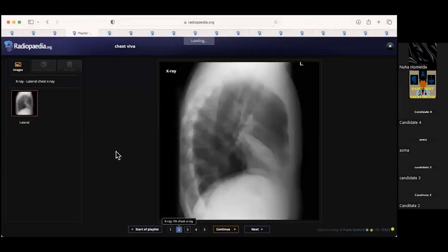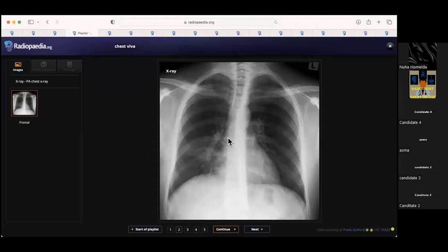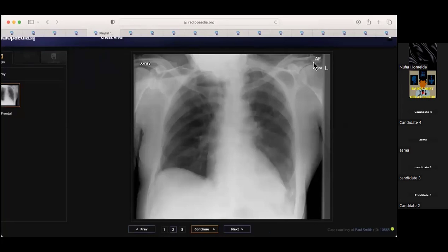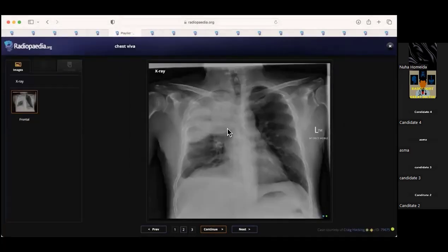This was a case of a middle lobe. Whenever you see the right heart border ill-defined, you have three diagnoses: middle lobe collapse, middle lobe consolidation, or pectus. You need to show the examiner that you're looking for any evidence of pectus, but there is no evidence of pectus. So those are the three main differentials whenever you see an irregular heart border. Here, always look at the supine film and look for a deep sulcus sign. This is a Klebsiella, and the giveaway was the bulging fissure.